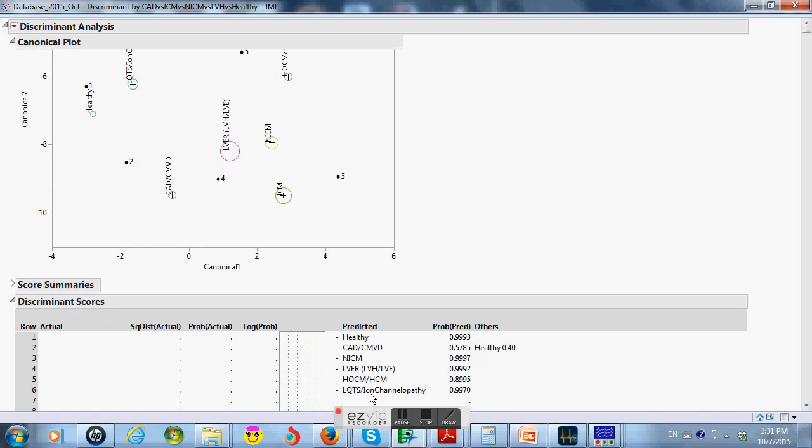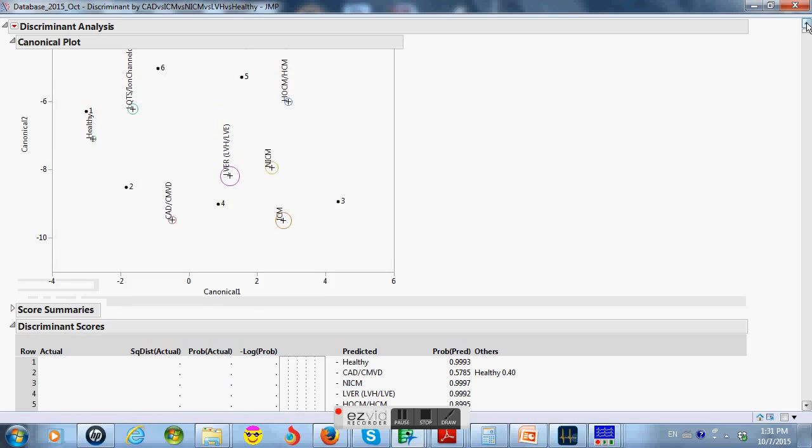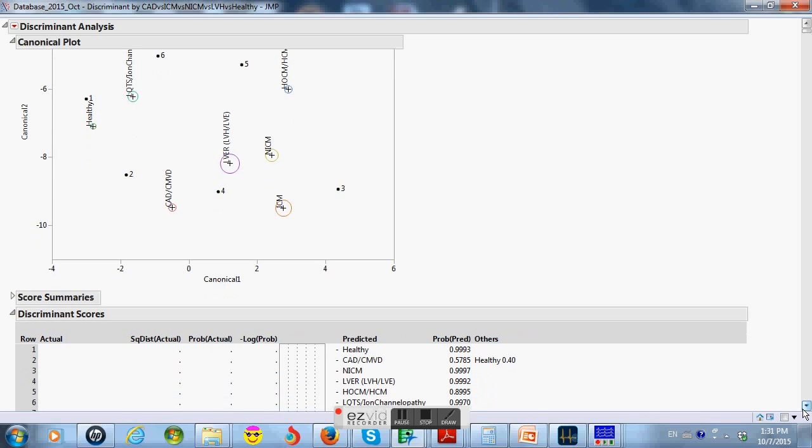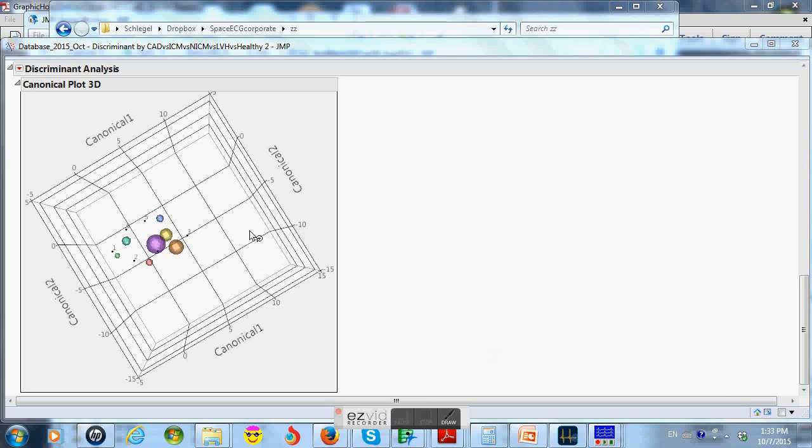Indeed, if we go down and look, that's exactly where he ends up as well, in spite of that normal conventional ECG that had a normal QTc interval, remember that. He also has one other abnormality which you can look at on his report, which is on the website elsewhere. Go ahead and maybe have a look at that if you're particularly interested in long QT.